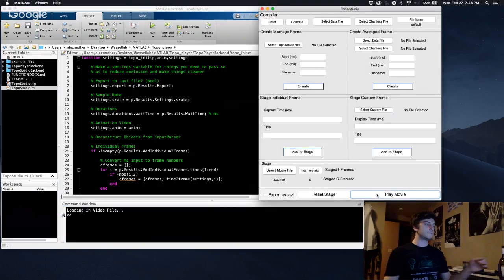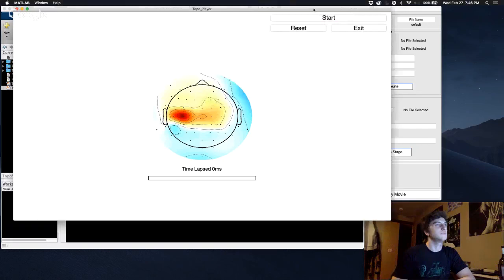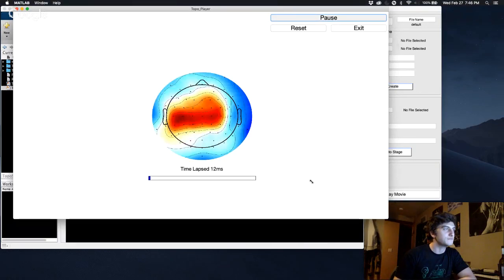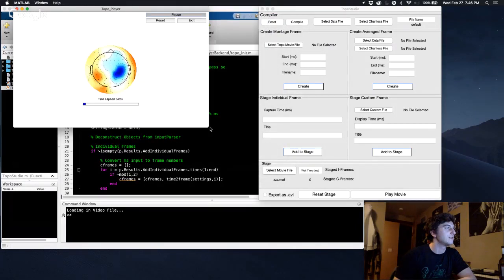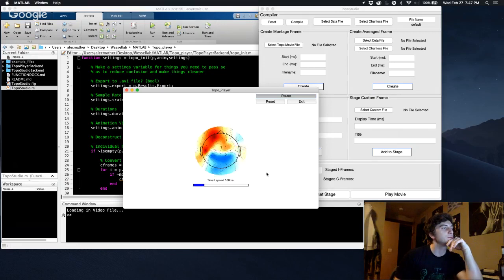And now let's do it. Dopeness. Yes. And now we can see our movie. And it's rather large, so I'm just going to make it a little smaller. But that is so sick. That's so dope to me.